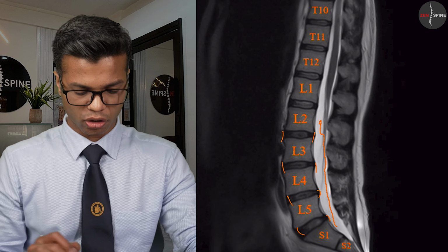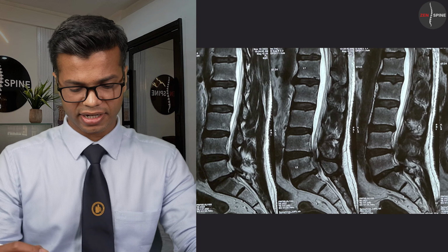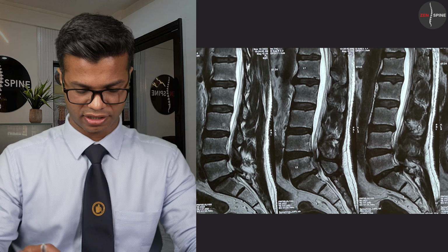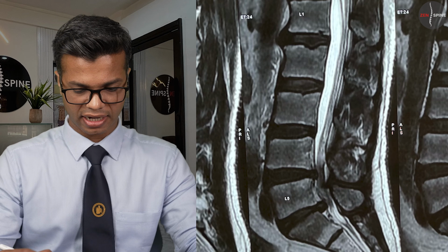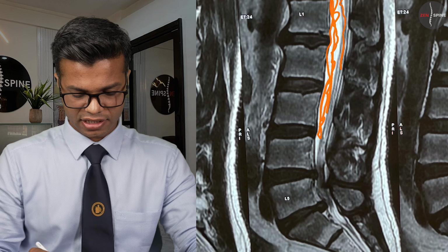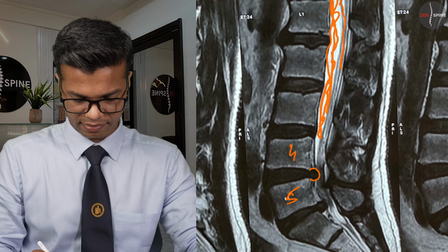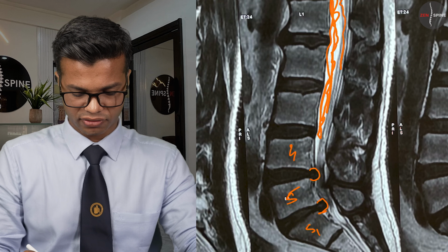Now, let's look at an abnormal MRI scan so that we can understand what a disc herniation looks like. Now, this is an MRI scan of a person who has disc herniation at the bottom 2 levels, as you can see in this picture. Now that you have already understood what a normal MRI scan looks like, you can yourself make out that till here there is a nice white free flowing fluid in the spinal canal, and the nerves are also free. But as you can see here, the discs are bulging at the bottom, L4, L5 level, L5, S1 level.